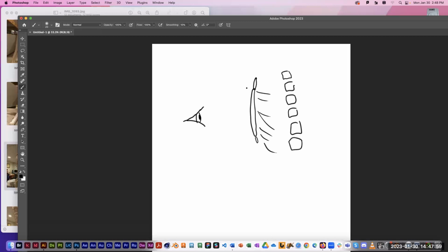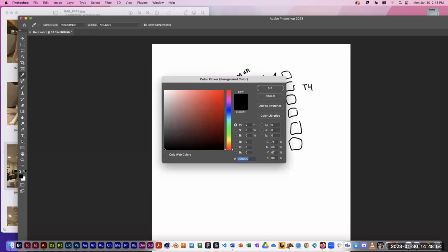I know that there's an anatomic relationship that sits right here at what's called the sternal angle, which is the junction between the manubrium and the body of the sternum. That level of the sternal angle lines up with the level of the T4 vertebra posteriorly. And anatomically, there's a lot of important things that happen at that level, such as the arching of the aortic arch inside the thorax, the junction of the left and right brachiocephalic veins to form the superior vena cava, and the bifurcation of the trachea into left and right main bronchi. So the trachea would come down and split into left and right main bronchi. It's getting all cluttered in here because there's all this important stuff happening at that level.